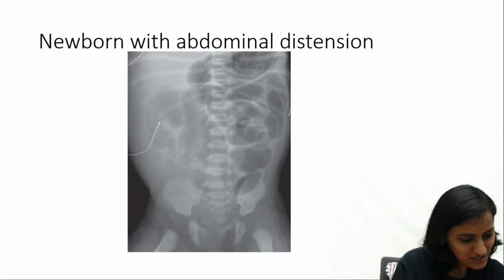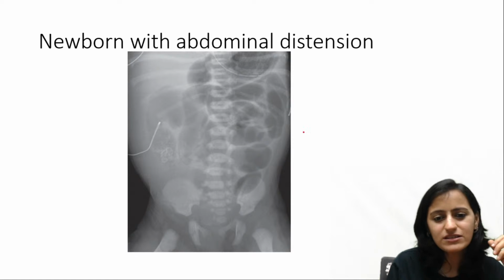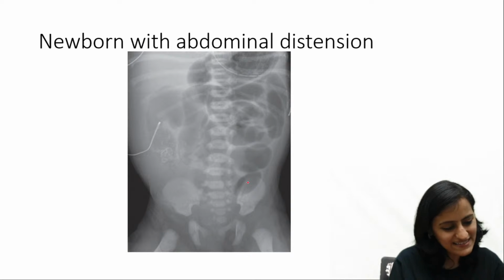Someone has mentioned it very close. So Raj Ravi is very close there, and this is not the colon which is dilated. Okay, this is not the colon which you see dilated. It's not Hirschsprung's either, as someone just rightly mentioned. Okay, so this is very close. Raj Ravi had mentioned, then Preet, and you have SD.